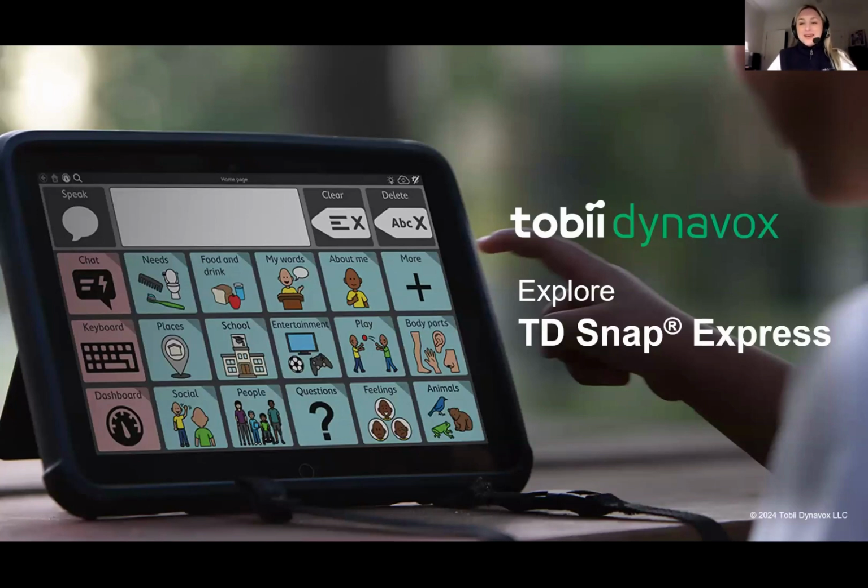So welcome, everyone. I am so glad to be here today talking to you all about TD Snap Express. My name is Lauren. I am a learning consultant here at Tobii Dynavox, and in today's demo, we are going to explore TD Snap Express, which is a symbol-supported page set that helps people express their wants and needs using theme-based phrases and words. So this page set provides a very simple and clear solution for effective communication.